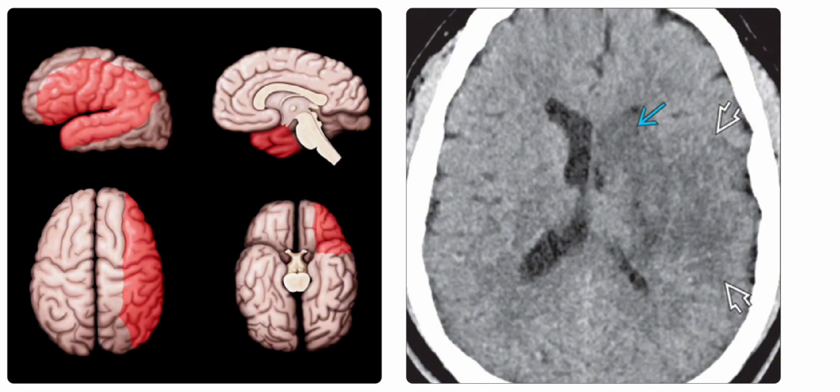the basal ganglia. Right is the axial CT image and it shows a large left MCA distribution infarct with involvement of the basal ganglia, indicating the involvement of the lenticulostriate perforating arteries, which typically arise from the M1 segment.